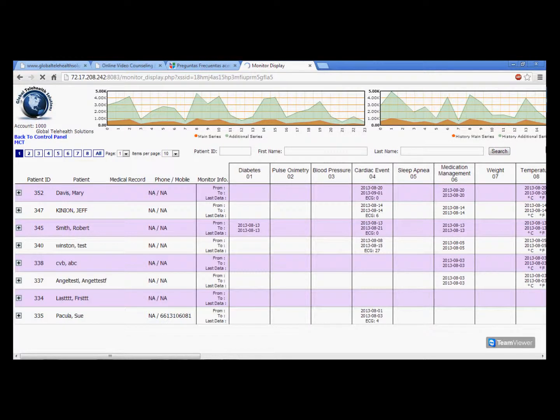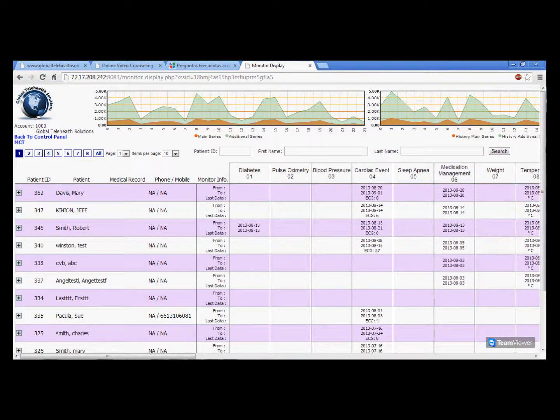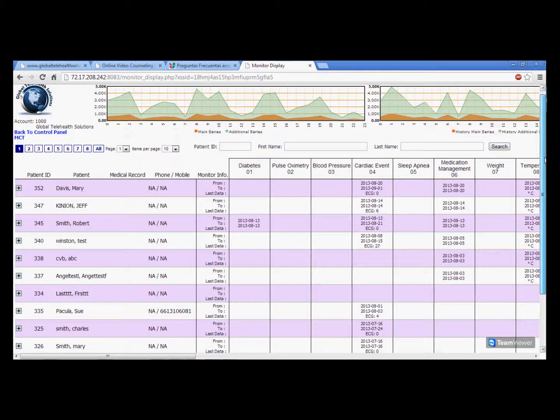Dashboard is where all the data is gathered and where I can query and where I can see and analyze the actual EKG. Show me my 10 most recent patients, which is most likely my patients that are all there being monitored.